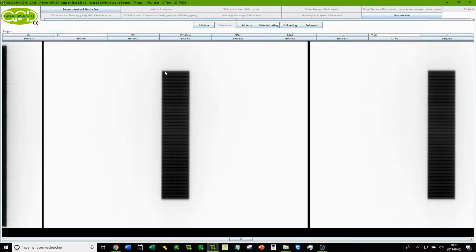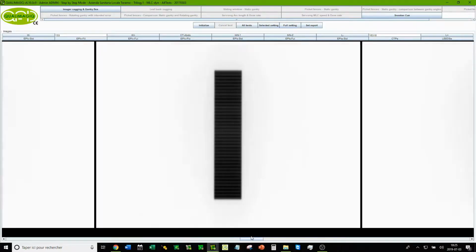For each image, the field is provided by a 1 mm width slit, which slides at constant speed from one side of the field over to the other side. The same dose is prescribed at all 4 gantry angles.